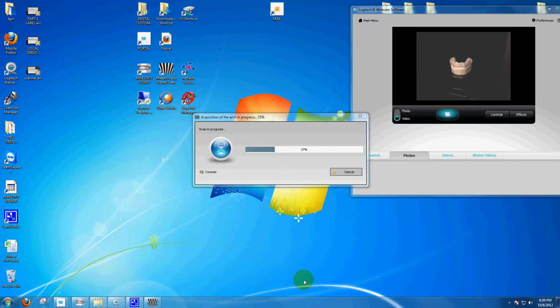You may have noticed that there were portions of the model that were missing through a faulty impression taken, possibly, or maybe through some faulty pouring of the model. It may be easier to build up some of that missing detail in a clay-like material so that we don't need to worry about it once the scanning is done. That anatomy will be in place already, made up by us.